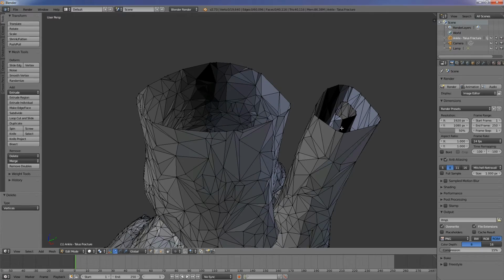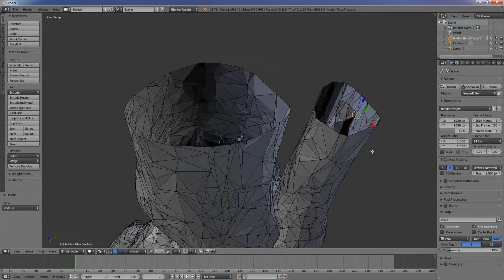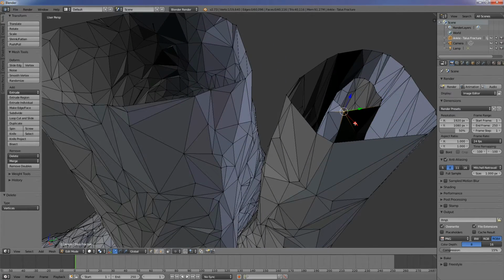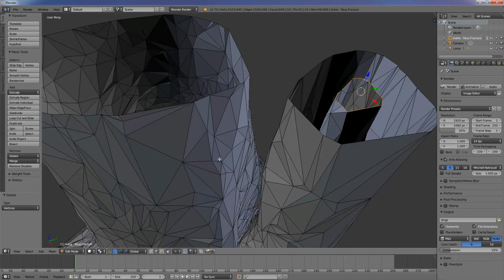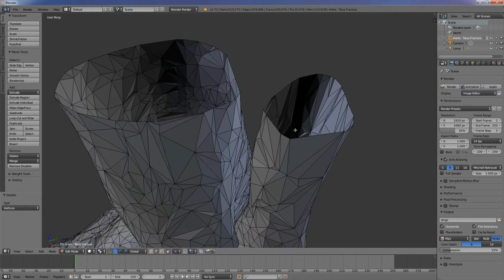Now, in the fibula, it's going to be a little bit more difficult. We can see that there's mesh that represents a medullary cavity here. I'm going to go to Edge Selection Mode, hit Alt, and select around. This is right-clicking. I'm selecting around this edge. And now what I'm going to do is expand my selection by holding the Control key and the plus button on the number pad. And I'm going to delete by X and V those vertices.